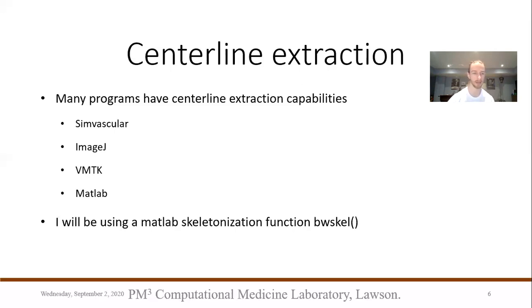Some programs that can do this are SimVascular, ImageJ, VMTK, and MATLAB. Within this video, I'll be showing you how to do this in MATLAB using a function called bwskel, which is part of the Image Processing Toolbox.